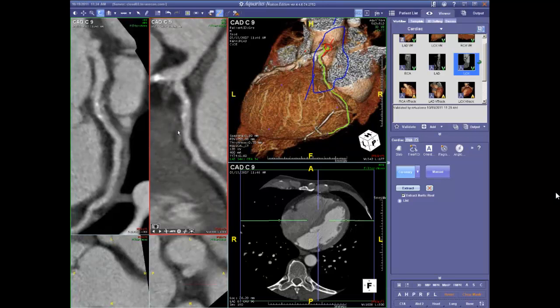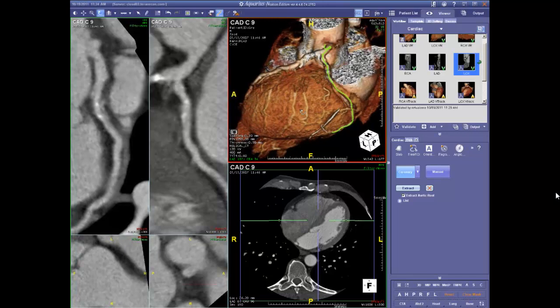We have obstructive disease, very likely, in a very complex plaque in the dominant right coronary artery. We have calcified and non-obstructive disease in the left anterior descending coronary artery. And we have mixed density non-obstructive plaque in the proximal circumflex. Well, it's still in the AV groove, and preceding what looks to be an intermediate-sized diagonal branch. There was a question about correcting some of these lesions.